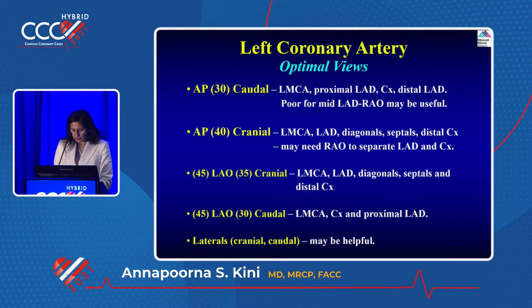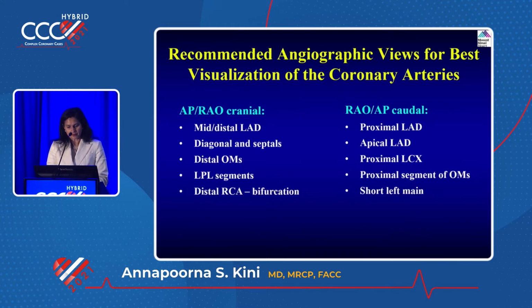So, cranial view for the ostium of the thing. These are some questions that we will go over now. Mid to distal LAD: AP cranial, right, diagonals, distal OM, LPL segment.